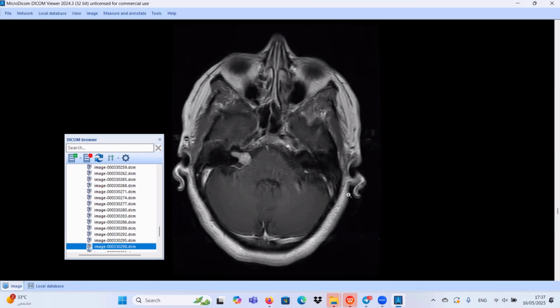How can we differentiate between both of these diagnoses? Sir, meningiomas, first of all, do not usually extend into the IAC. Secondly, they have a dural tail and are more common in females. Also, sometimes a large meningioma can extend inside the internal canal, but the classic teaching finding to differentiate is that any extension inside the internal canal goes with acoustic neuroma. Yes, you are right.